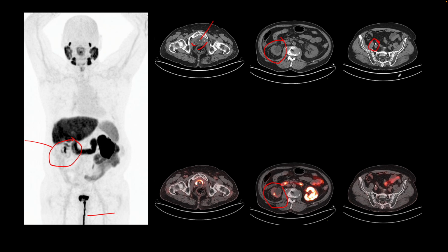So this is an acute finding of a stone obstructing in the ureter, leading to hydronephrosis, and should be reported, and not just reported, but you need to call the referring physician because something needs to be done about this. Otherwise, this hydronephrosis will worsen and the kidney will eventually die and will have no function.